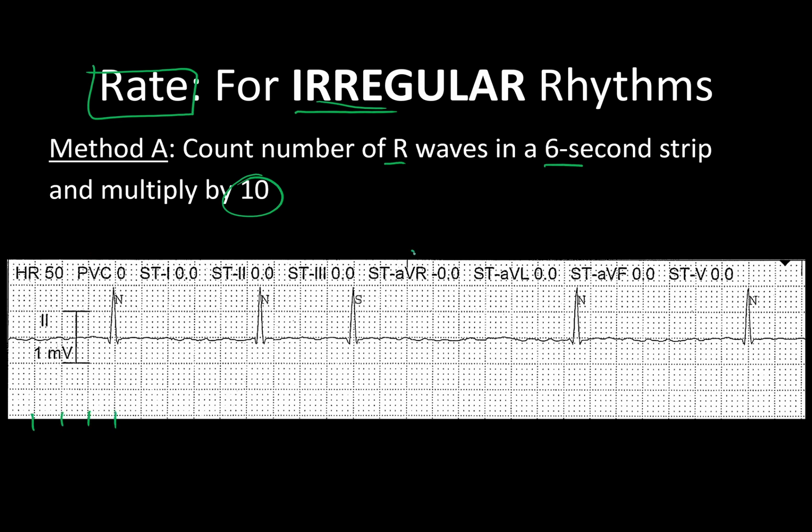Or if you look right here at the top, you'll note that there's a darker hash mark, and again over here at the far side it has one as well. And those are marked every 3 seconds, which then makes the math a lot easier, right? If you got 2 solid marks, there you go. And I'll make the effort to circle those on all of the strips today. That way you'll have a chance to really see those.